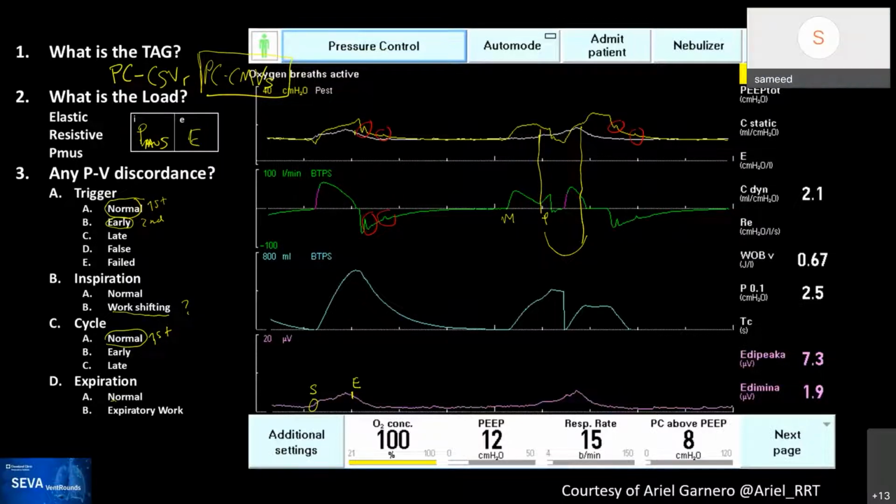So what does that make you suspect? That they're cyclic for some reason. They're happening like they're oscillating back and forth between something. I don't know. What gives you that on the airway? Vocal cords. Well, he's intubated, hopefully. I mean, trachea and everything is cartilages. So usually if I see this at the same intervals, that makes me suspect that there is either mucus dangling there or secretions dangling there, and they're just creating these oscillations. And so I would suction the patient or check the circuit. That's what I would come for. Yep. Any comments?